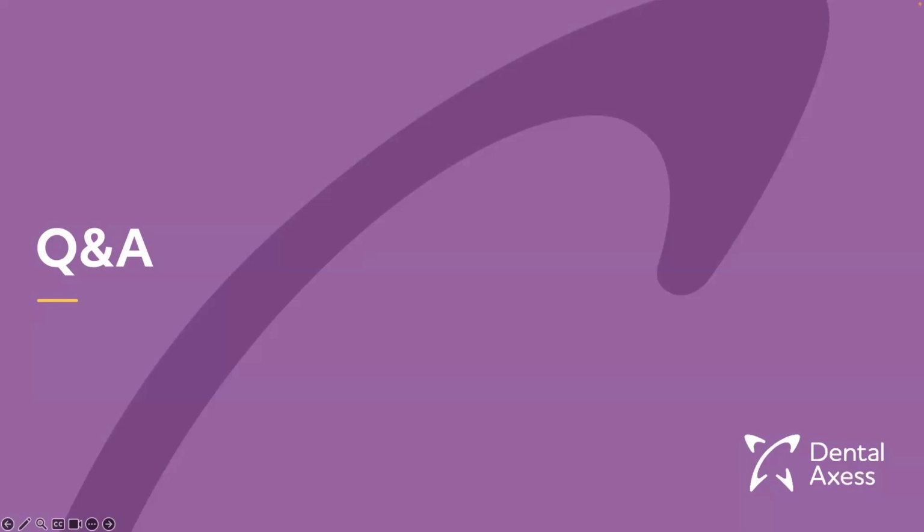But if you request, I don't want ideal, I want just to improve this and that, that is also possible. That can be done, but you need to understand we will change the final position, and probably not achieve all that needs to be done on that treatment plan, by reducing the number of aligners.